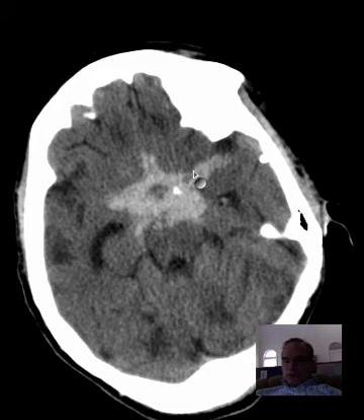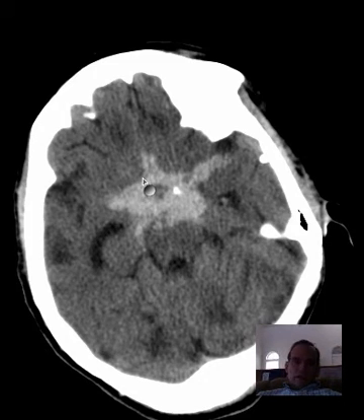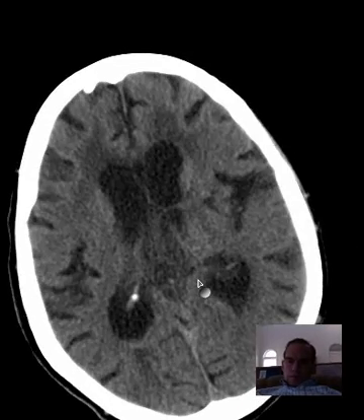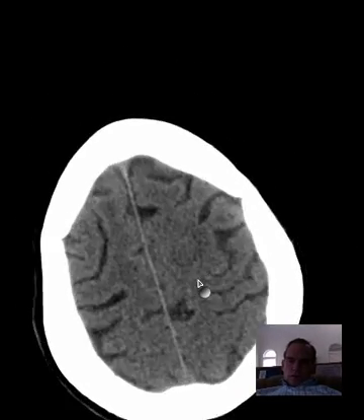So this is a configuration that actually represents somewhat the stellate configuration of the circle of Willis, meaning middle cerebral arteries go out this way, anterior cerebral arteries go this way, and posterior cerebral arteries are more subtle but tend to tuck in the midline, closer to the midline when they course posteriorly. Okay.